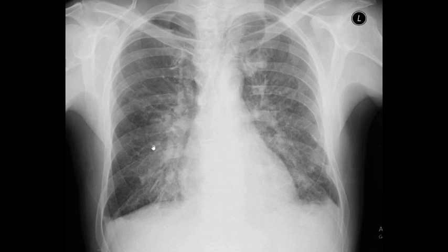Then we see how all of these markings, these vessels and the tissue around them, there is more white here. That is not normal, it shouldn't look like this, it should be darker, especially in the middle and lower, and here also in the middle and lower lung field, there are many patchy white opacities that are present in these fields. That is actually pulmonary congestion or pulmonary edema. So these are bilateral diffuse patchy opacities that are forming.